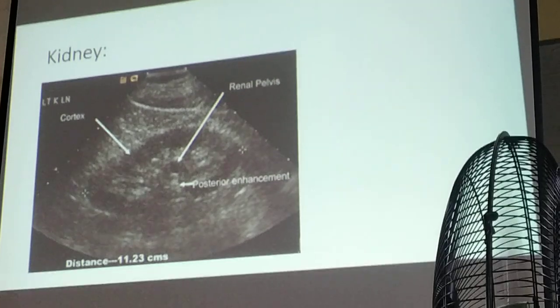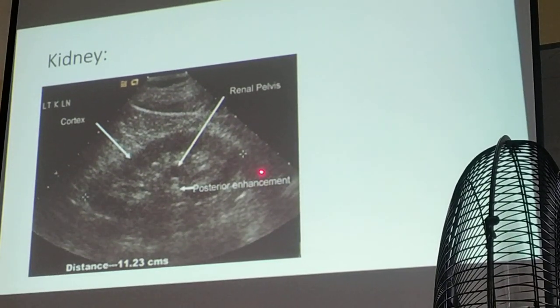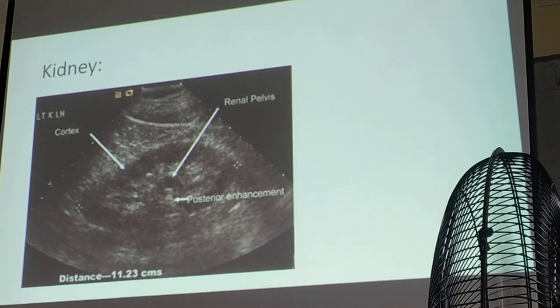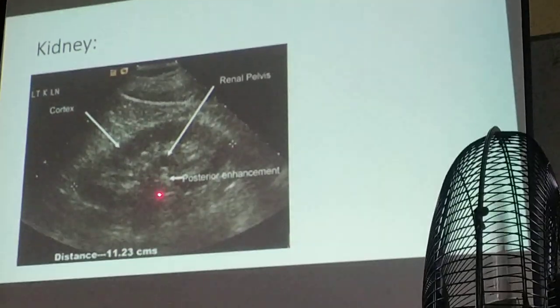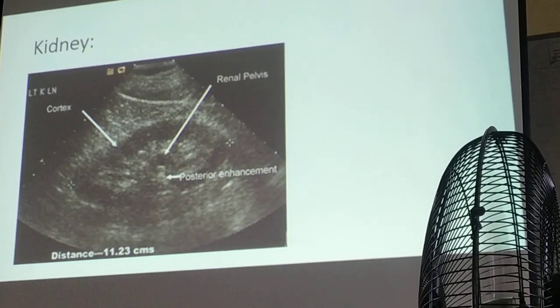Most of the time, you would see the cyst on the cortical area. That's why you would see the description, cortical cyst of varying sizes, the largest of which measures. Okay? But in some cases, in a polycystic kidney, you would definitely see cystic structure also at the medulla.